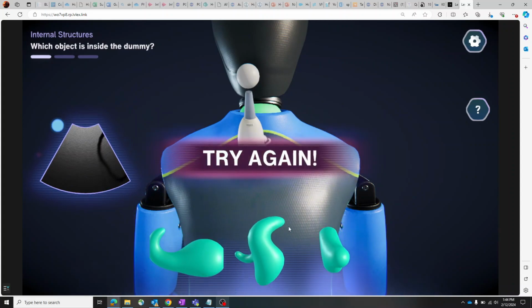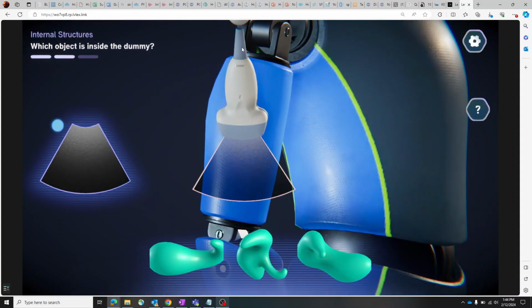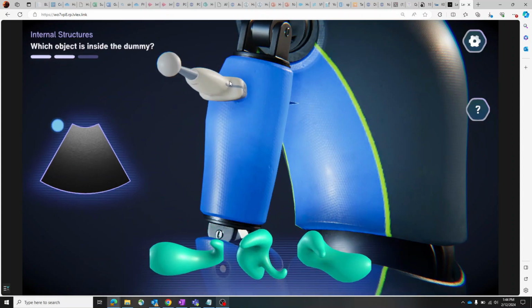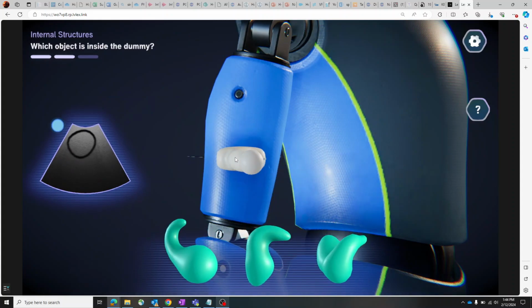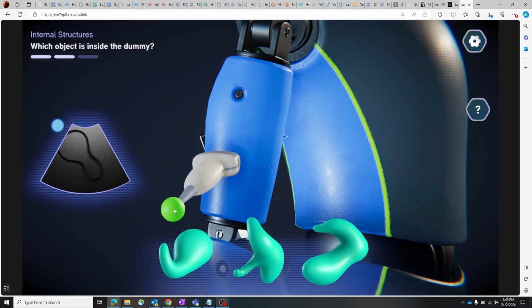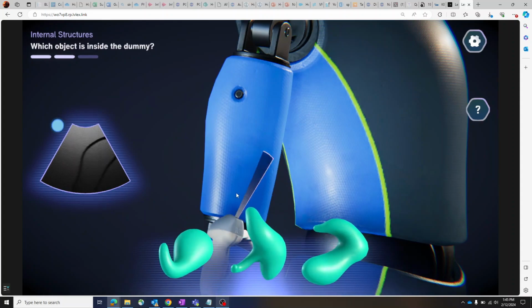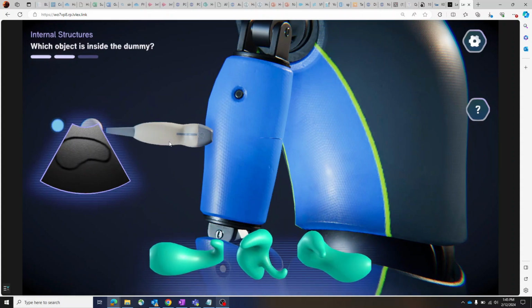We have a little timer down at the bottom, and you're going to be instructed to breathe in time. This is just a practice and a reminder that you shouldn't be holding your breath. You should just be breathing normally while you're doing the assessment. This is an example of how we can do more companion guides. So if you ever wanted to refresh your memory or have something up with you while you're doing it, to breathe along with, we can do that. Sometimes we can make games in preparation for procedures, and sometimes we can make companions that you can play around with or follow along with that give you guidance.